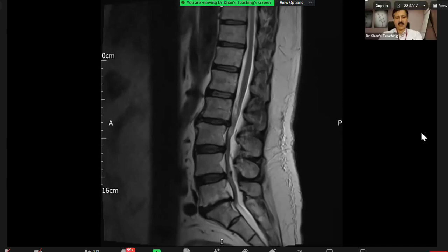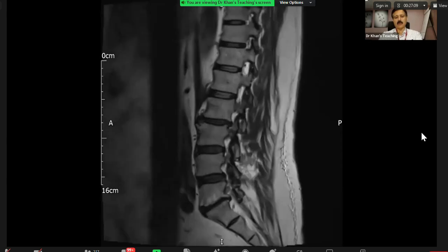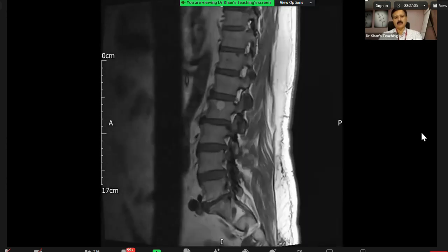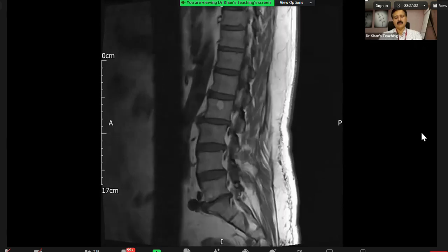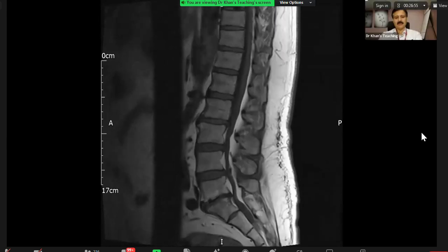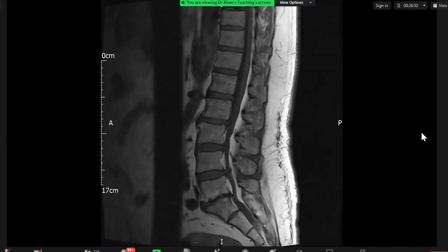Okay, very good. Now, keep continuing. Next sequence, please. Next series. Keep scrolling. So, another T1 again. Stop. The same level where I had stopped you. What is happening? So it's iso-intense. The abnormality is iso-intense to cord. Please continue.